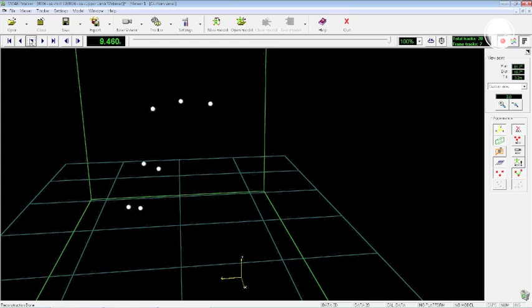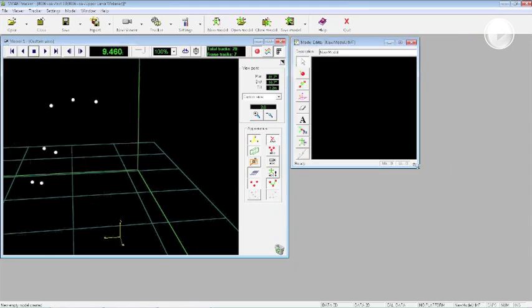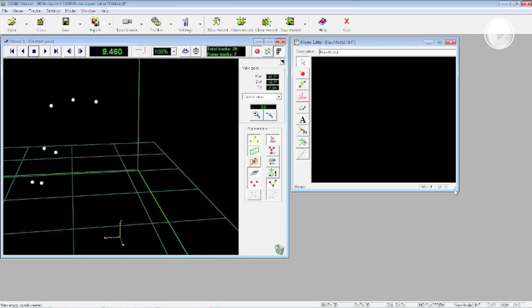Both protocols can be applied. Today we are going to talk and visualize which is an anatomical protocol. So, as I told you, we need to create a new model. So to do this, we click on New Model. Another window opens. I enlarge it for you.